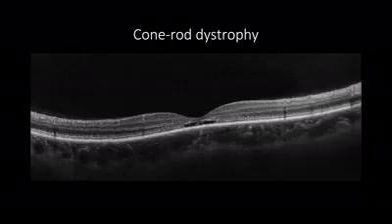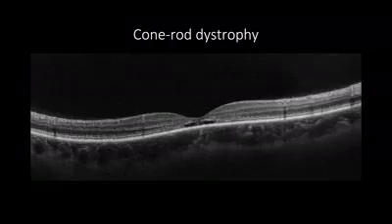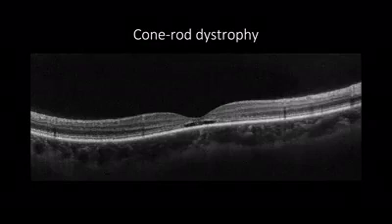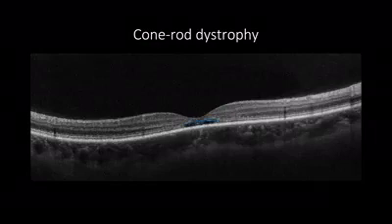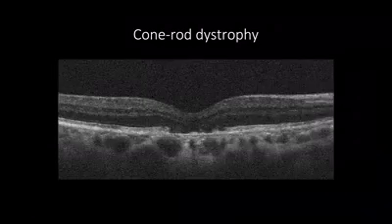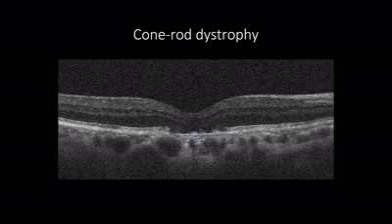Sometimes, when Stargardt disease is complicated with cone-rod dystrophy in advanced stages, it may feature a subretinal hyporeflective gap in the outer retinal tissues with some residual granular deposits due to loss of ellipsoid zone and external limiting membrane, forming a hyporeflective space. In advanced stages, it can be presented with outer retinal and RPE atrophy.